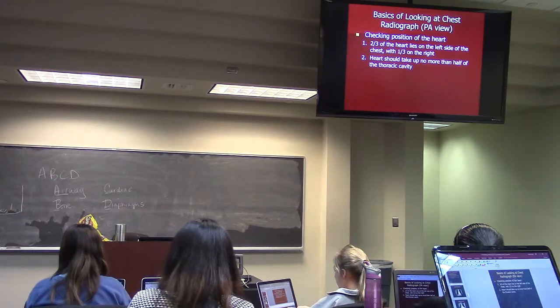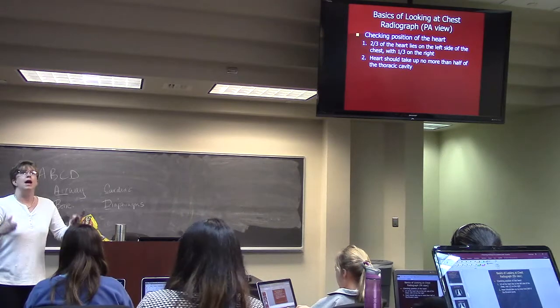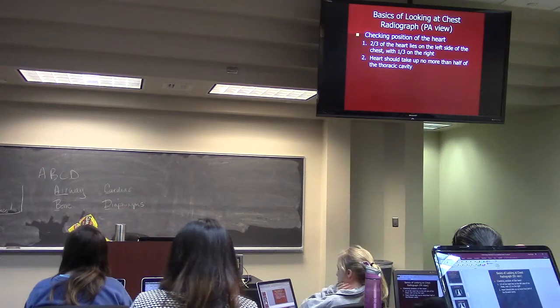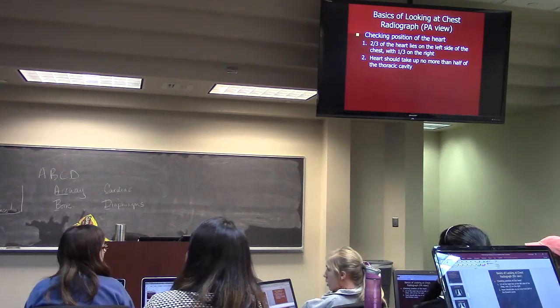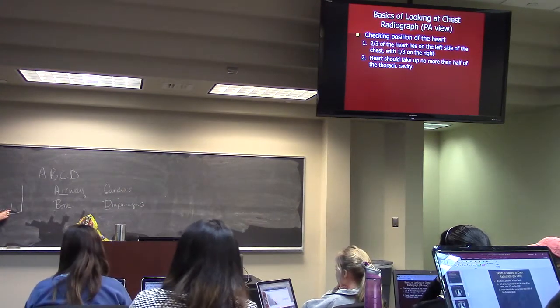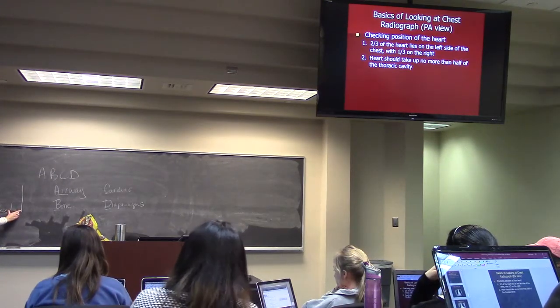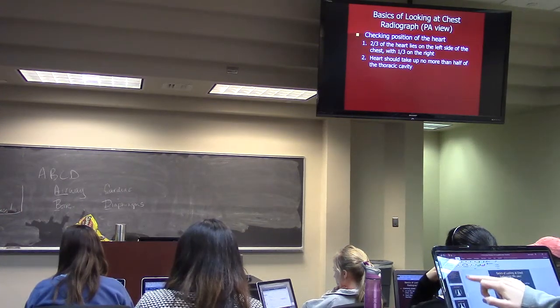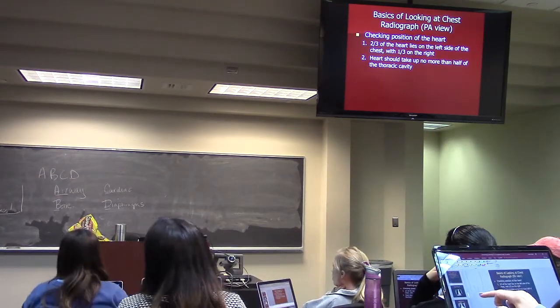Can we use that on an AP? No. Can I use that on a PA? Absolutely, we use it all the time. In fact, if I'm using my picture up there, and I have electronic, because now it's all electronic, I will put my finger here and I will measure that heart every time. And I will put it, nope, it's not halfway across the chest.